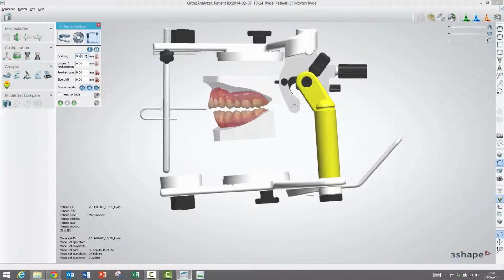What we're supposed to observe here is the mandible opening up according to the axis. So instead of creating an open bite vertically, it does it using the axis. So either you enter the value or you use the black arrows to create this simulation, like the other fields.